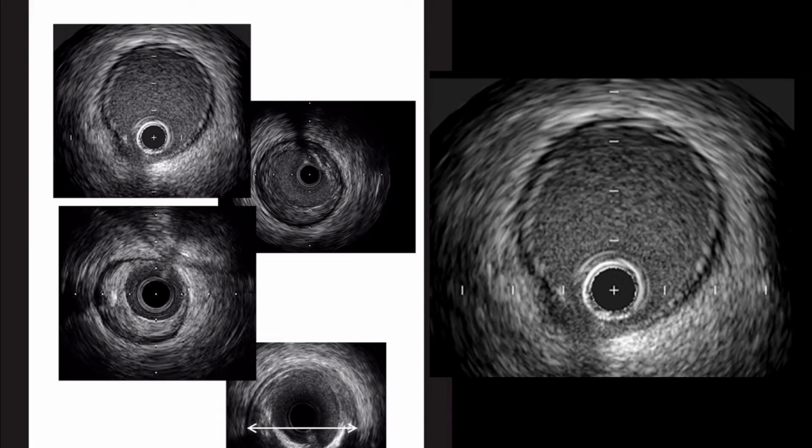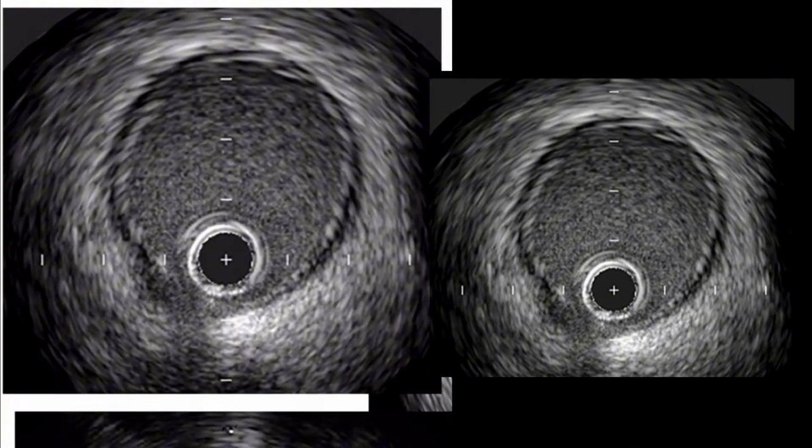So what we're going to do is really go through examples. We'll start with healthy and then work our way through. There are, of course, way more complex cases, especially with OCT imaging, that I'm not going to go over, but if you have a case or see something or have a question about it, just send it to me. I don't want to overwhelm you right away, so let's just go into a few examples to be able to tell the big things.